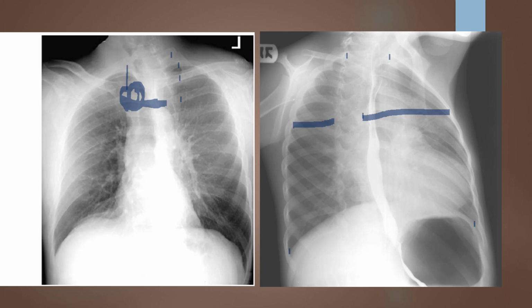Now I'm going to follow this clavicle down, and I'm going to find the sternum, and the sternum manubrium is right here. So now I need to come up, and I see vertebra 1, 2, 3, and 4, and my manubrium is at about that fourth level. So I have good mid-coronal tilting here.